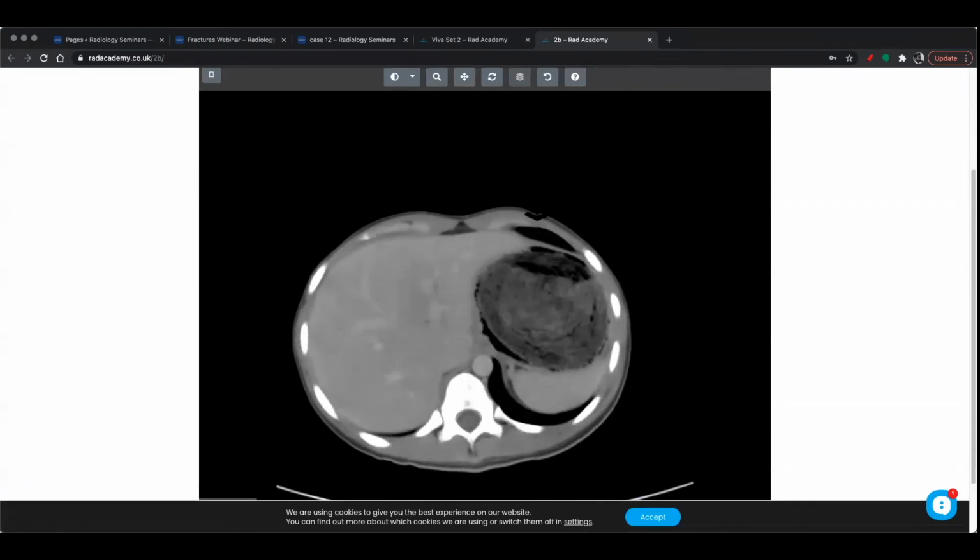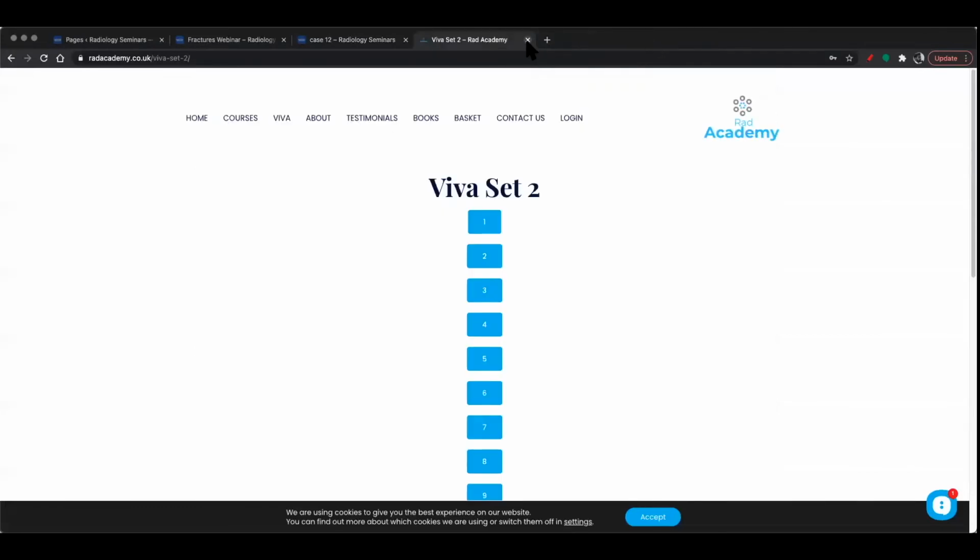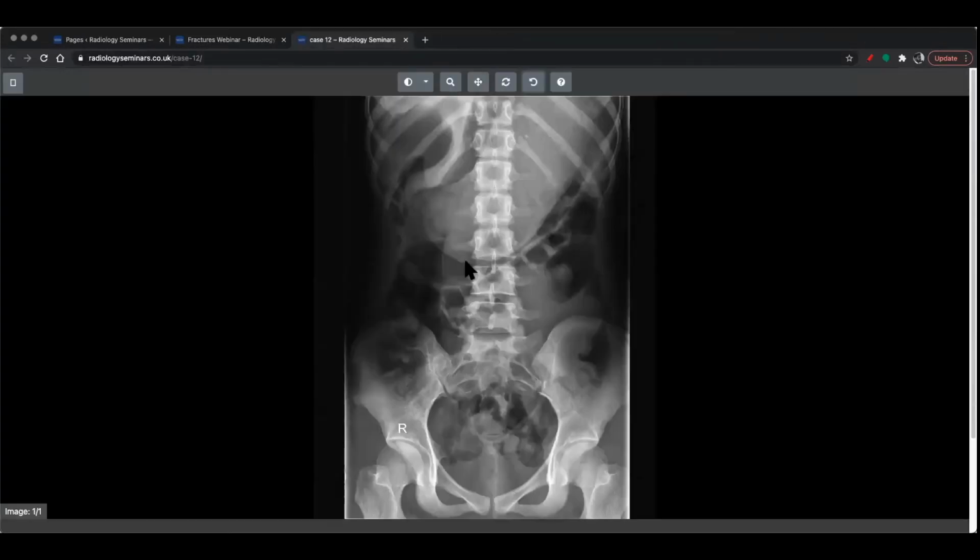They've been doing this for quite a while and ended up having this massive hairball sitting inside their stomach, resulting in bowel obstruction. Now, the thing is, this is a weird and wonderful case, but if you go back to basics, if you saw nothing else, back to basics would be the small bowel obstruction. Back to basics would be the soft tissue density sitting in what is normally the contours of the stomach. Not often that you see a soft tissue density sitting in the stomach.